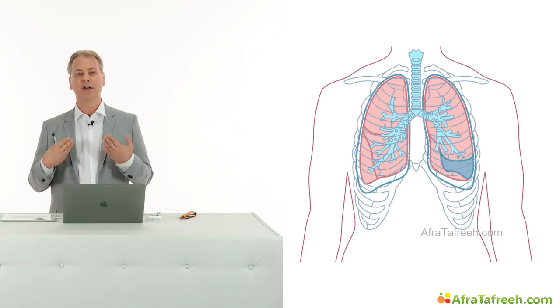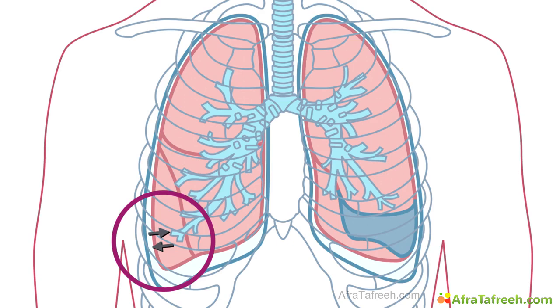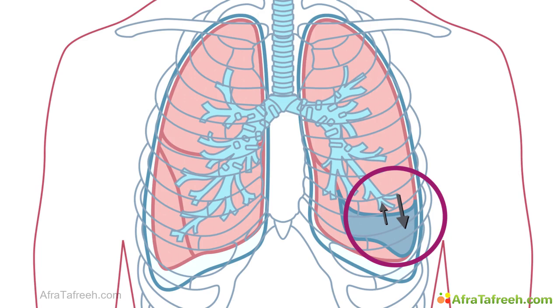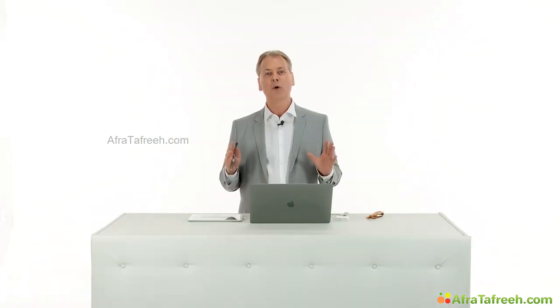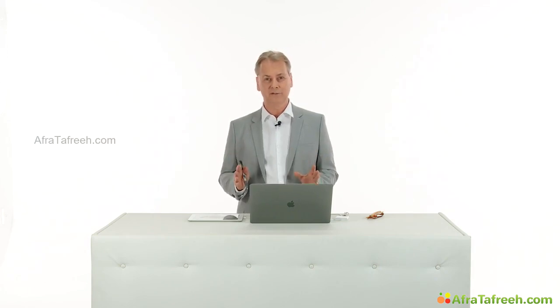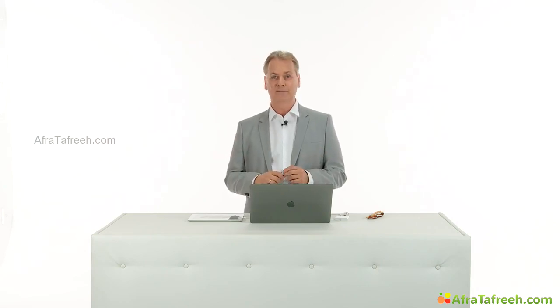Pleural effusions occur because there is an imbalance between the production of fluid and the removal. Normally, you have approximately 20 mL of fluid within the pleural space. This is actually important so that the visceral and the parietal pleura can actually move. If fluid accumulates, you will have separation of these two parts of the pleura, and you will see a space in between. Under normal conditions, you will only have a separation of a few micrometers, so you will not see it on ultrasound. So as soon as you see a separation, you can assume that a pleural effusion is present.